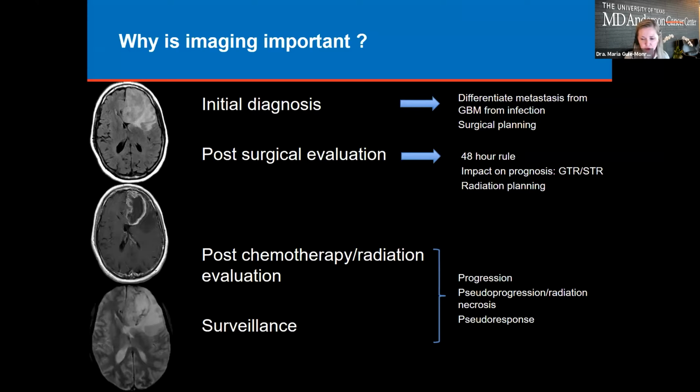Surveillance imaging during and after treatment is used to evaluate treatment response and for evidence of progression. This is the greatest challenge. The greatest challenge in this post-treatment period is to correctly distinguish between progressive disease, pseudoprogression, and pseudo-response.